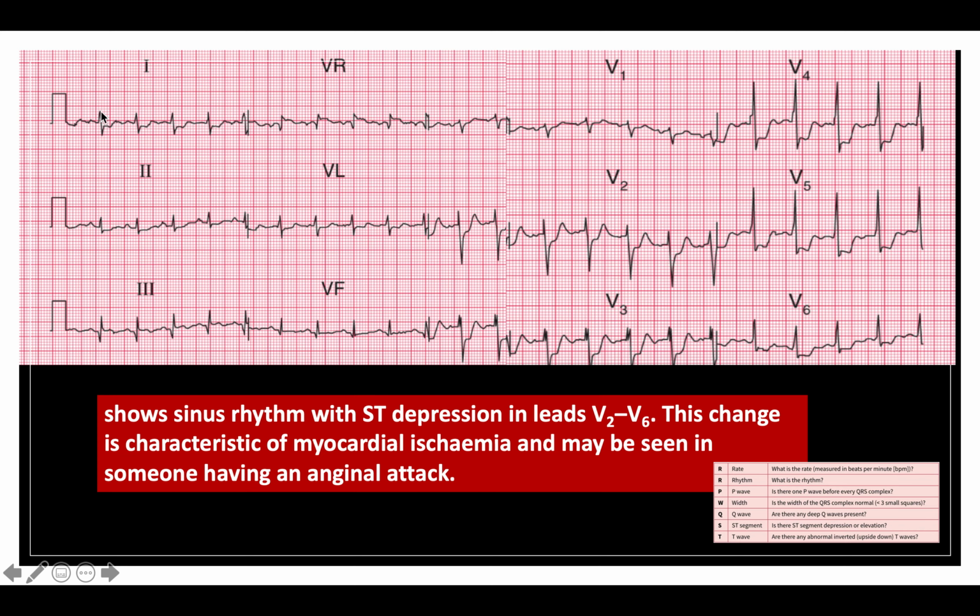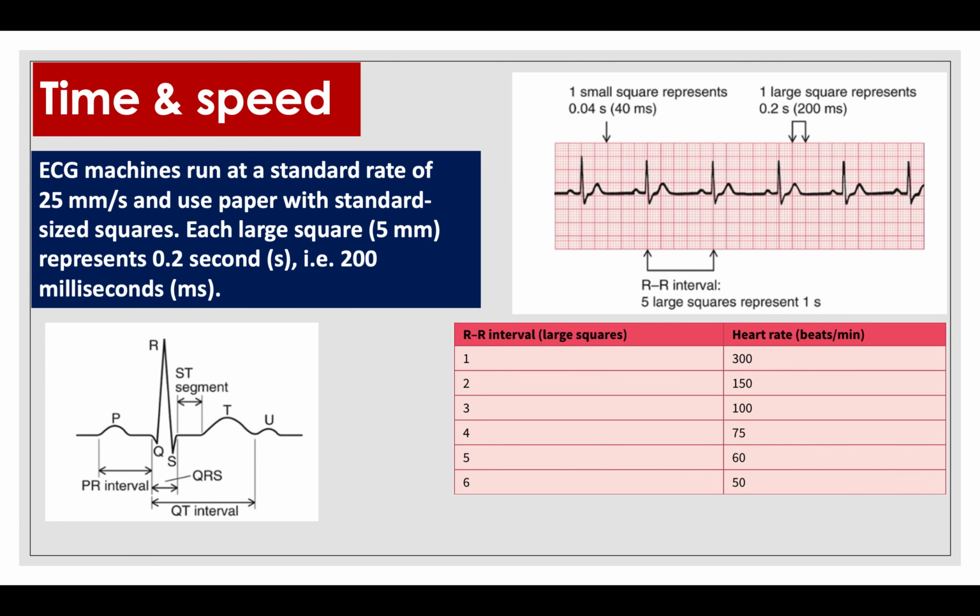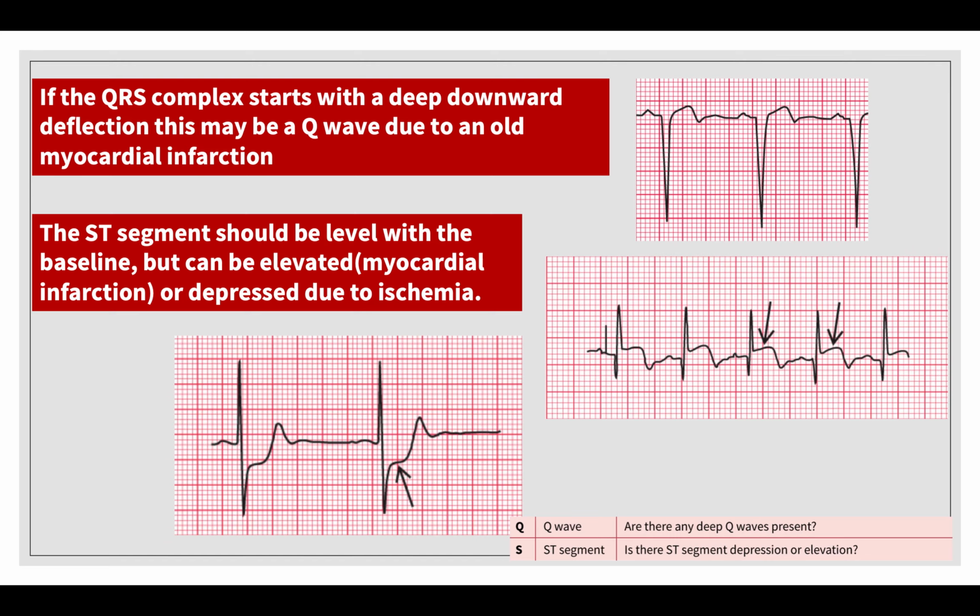We know from our previous slides that this is roughly between 150 and 100. So this patient is clearly tachycardic.